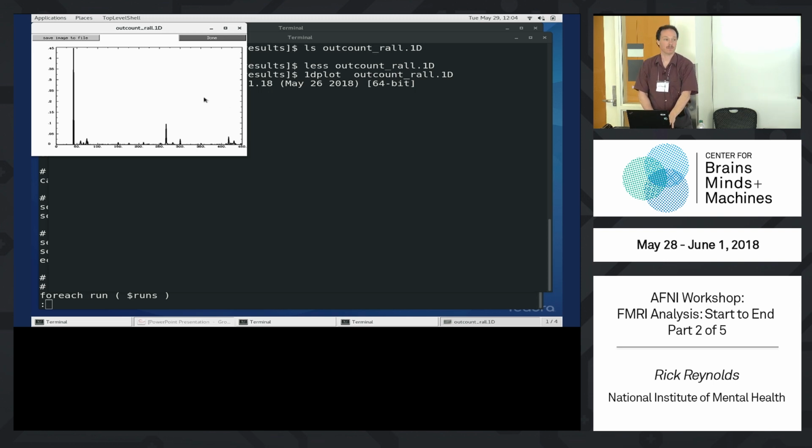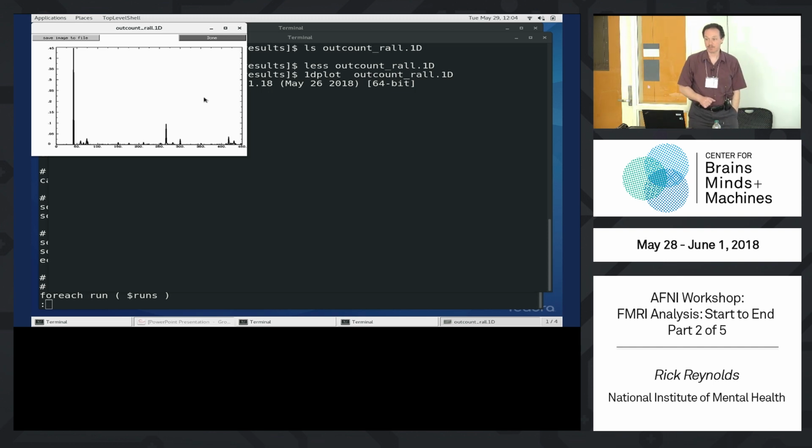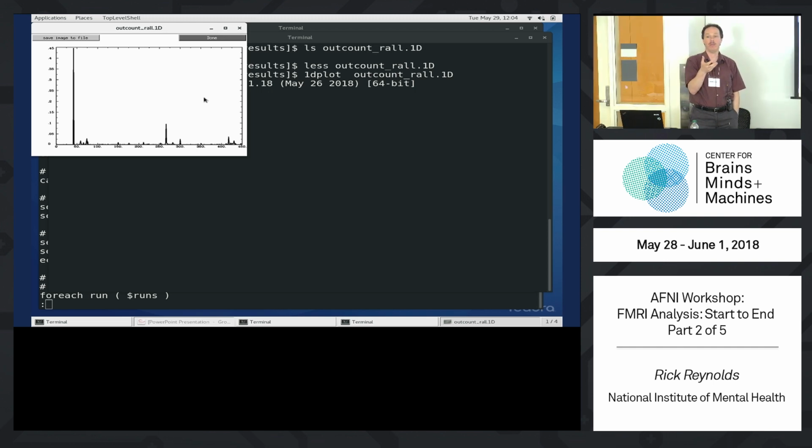Questions? This is post-registered data. This is pre-registered. So you could run this again after registration, and it might, in a different way, show you motion artifacts where, if the subject sneezes or hiccups or something and just jerks their head a little bit in the scanner, you've got good slice, good slice, good slice, bad slice, very bad slice, then they go back and you get some good slices back when you start wrapping around. So a third of the slices are screwed up to various degrees or more, depending on their motion, of course. So how does 3dvolreg, how does your volume registration step manage to align this with the base? It can't, right? Many of the slices are screwed up. Some are good, some are horrible. It can't fix that. You can't.